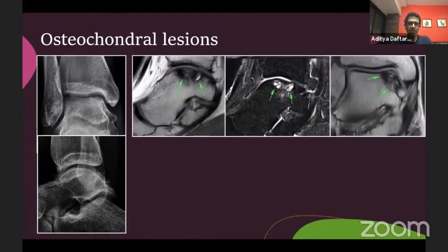Now, as orthopedic surgeons, oftentimes one is not entirely sure what this means. So on this X-ray, you can see this just looks like a subtle undulation of bone here. Nobody has a sense for how bad this osteochondral lesion is, how big it is, or how problematic it could be. You look at the MR, and as radiologists, we're very excited. We see subchondral cystic change, we see cartilage loss, we make all these wonderful descriptions. We say undulating surface, blah, blah, blah.